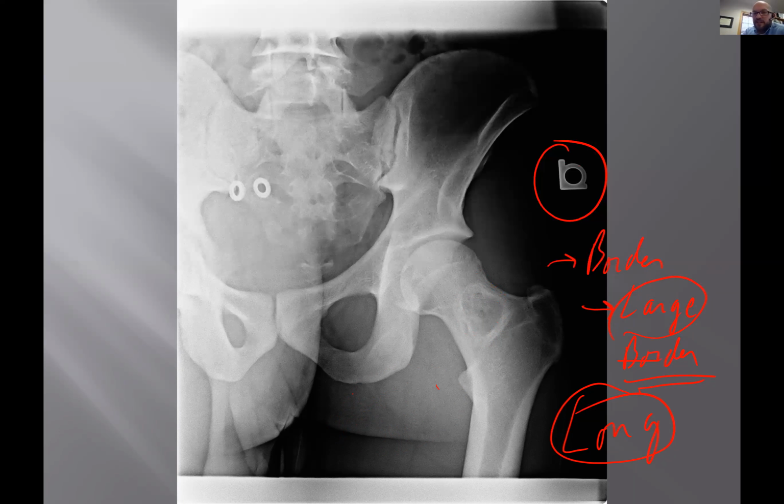And in this case, it's going to be fibrous dysplasia. The problem is we've got dull pain, and so we get confused, like, well, maybe this hurts. But you can have dull hip pain for a million different reasons. I would definitely call this fibrous dysplasia, and it's a leave me alone lesion.